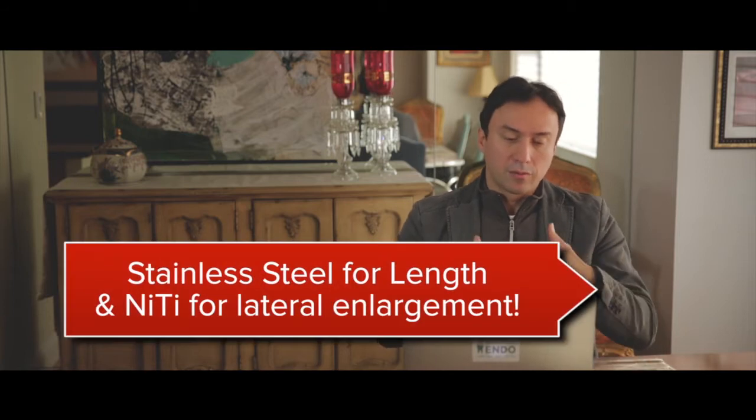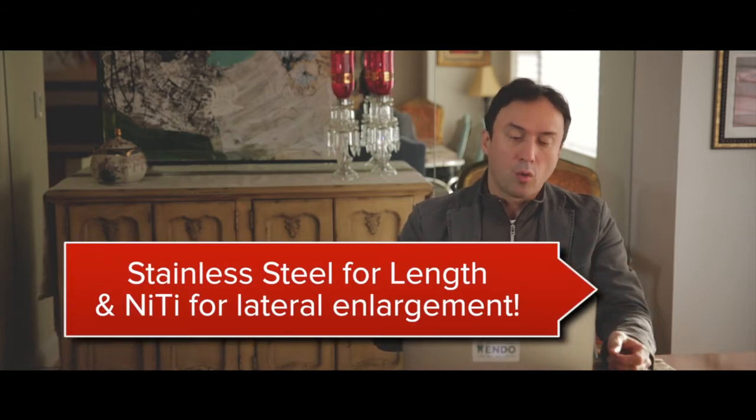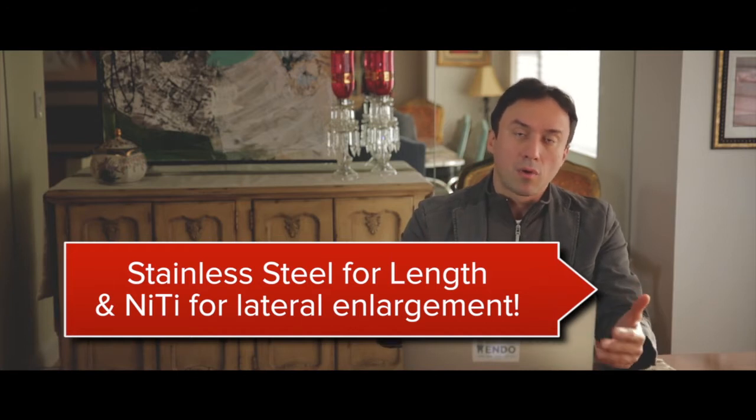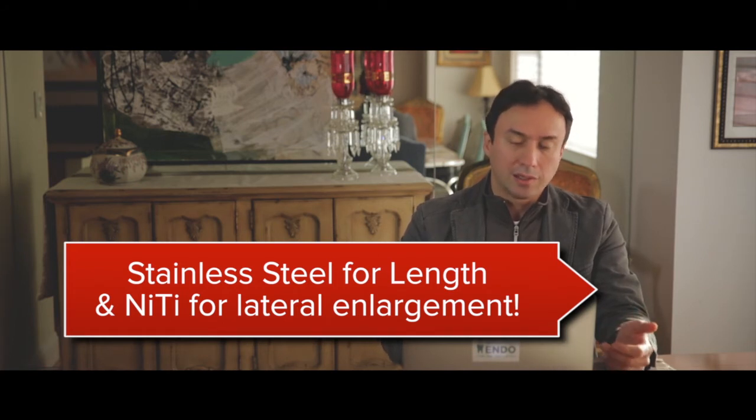Don't forget the rule of thumb: stainless steel, because of its strength, allows you to gain length, and rotary files, because of their flexibility, allow you to enlarge laterally. So always use stainless steel hand files to gain length, and then use rotary NiTi files to enlarge the length that you have gained laterally, far more efficiently than you can with stainless steel files.